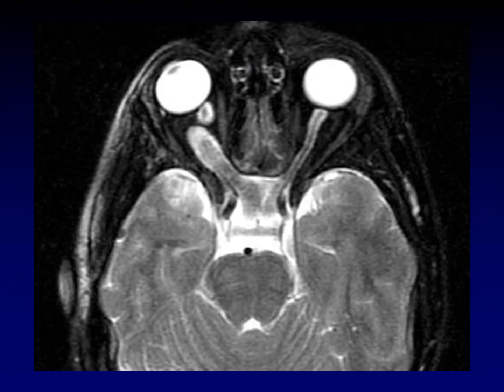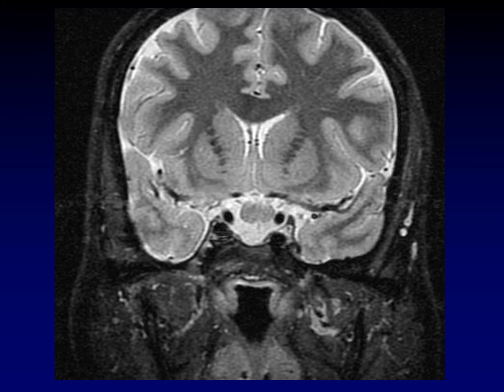Here's glioma seen in another perspective, enlarging the optic nerve and its entire nerve sheath tract, the normal nerve on the other side, and you can see it extending back into the chiasm. Here's a coronal example of a glioma affecting the chiasm. Remember that the optic chiasm should be, I don't know, a quarter of the thickness of this object. This is hugely thickened by glioma.